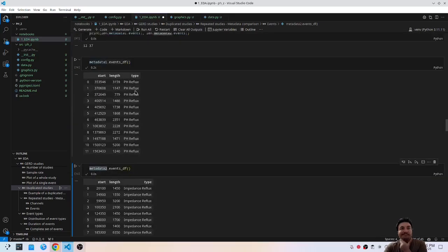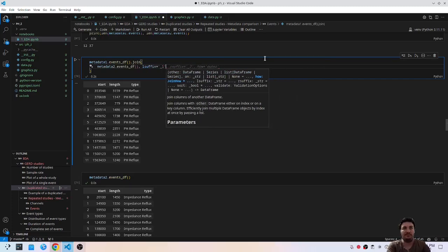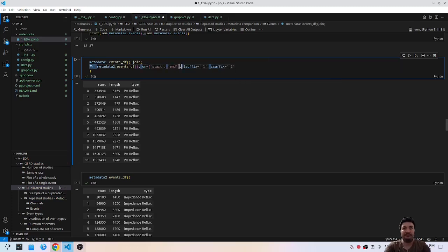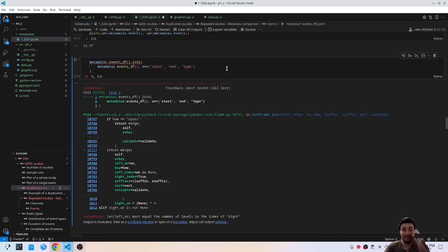Okay. Can I do on start, end, and type? This is not join, no?